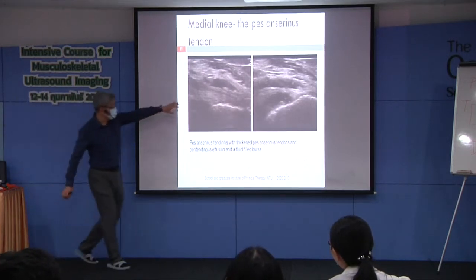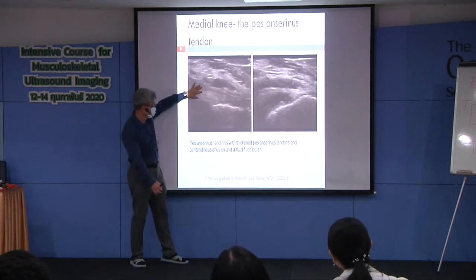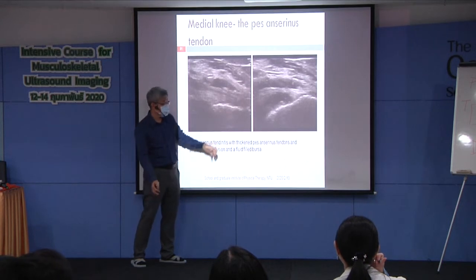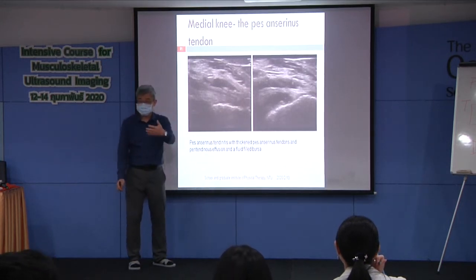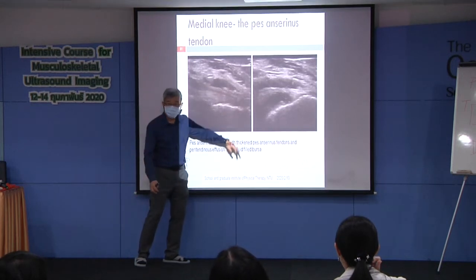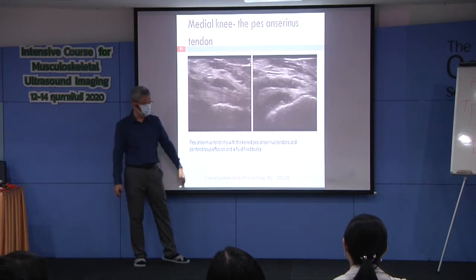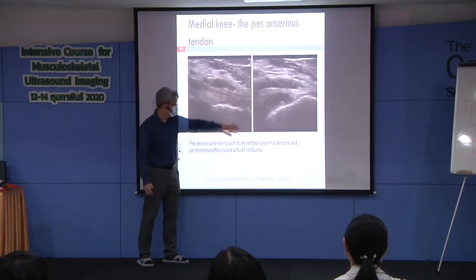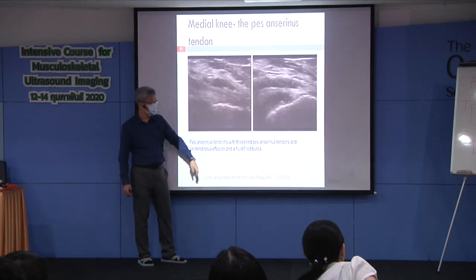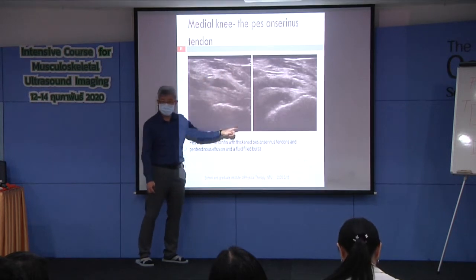Okay, fluid, hypoechoic, dark tendon. So these days, you are very good. Your colleague shows you this is a tendon, and you don't know what's wrong with it. If the scale is correct, the angle is correct, cortical irregularity, hypoechoic, fluid, you ask him, did you make any pictures with color?